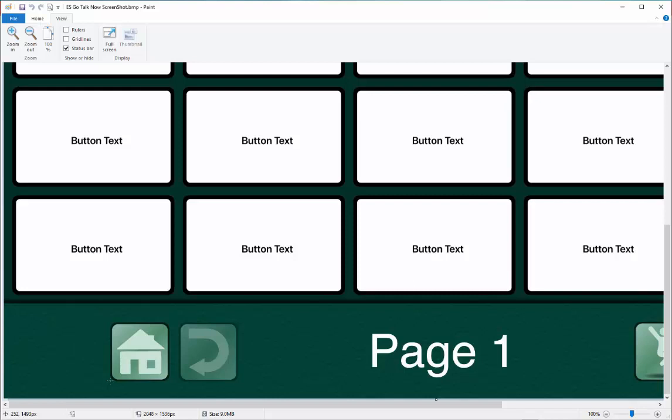So I need that location as the X and Y coordinates for my rounded rectangular cut I'm going to make. And by the way, you'll notice that when things are nicely aligned like this horizontally, the Y value over here is going to be the same as the Y value here. So we can save ourselves some time by just reusing the Y value. When you have two things that are vertically oriented, you can reuse the X value.